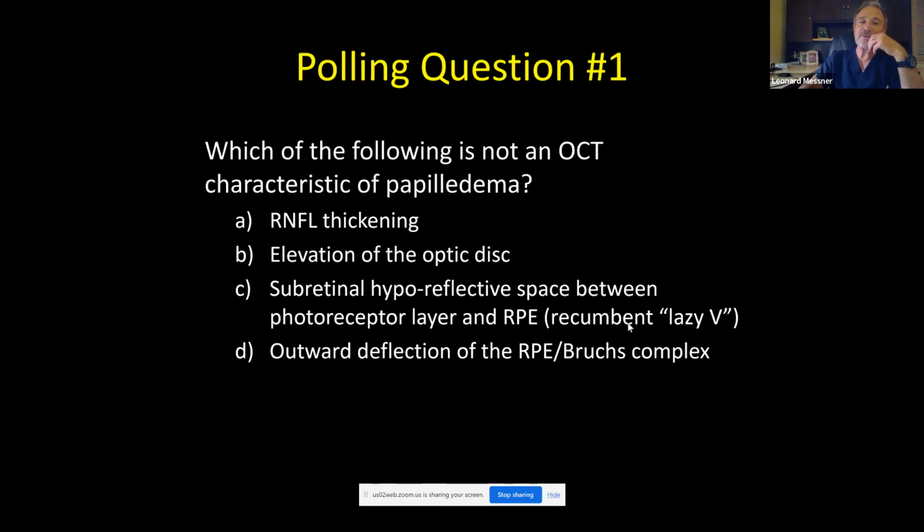I'm looking for the characteristic features of elevated intracranial pressure in the setting of idiopathic intracranial hypertension, which is a flattening of the posterior sclera, a distension of the optic nerve sheath, a tortuosity or kinking of the optic nerve, and also the presence of an empty or partially empty sella, and this is the kicker, the rest of the brain is normal. With an abscess, of course, the rest of the brain is not going to be normal.